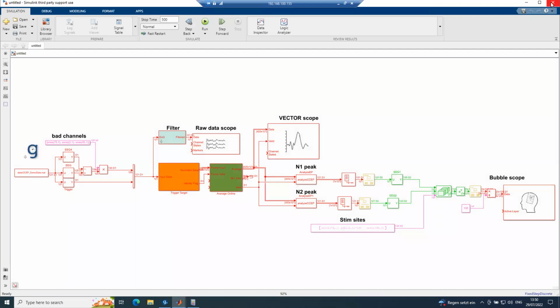Okay, so this was the CCEP mapping tool. Basically, this is just there for demonstration purposes. But if someone is interested in doing CCEP, they can just replace the real-time clock and the two file block with an amplifier, and then they need to set up the channels accordingly and have the brain model, and then they can do the same CCEP processing as we do for the offline processing.